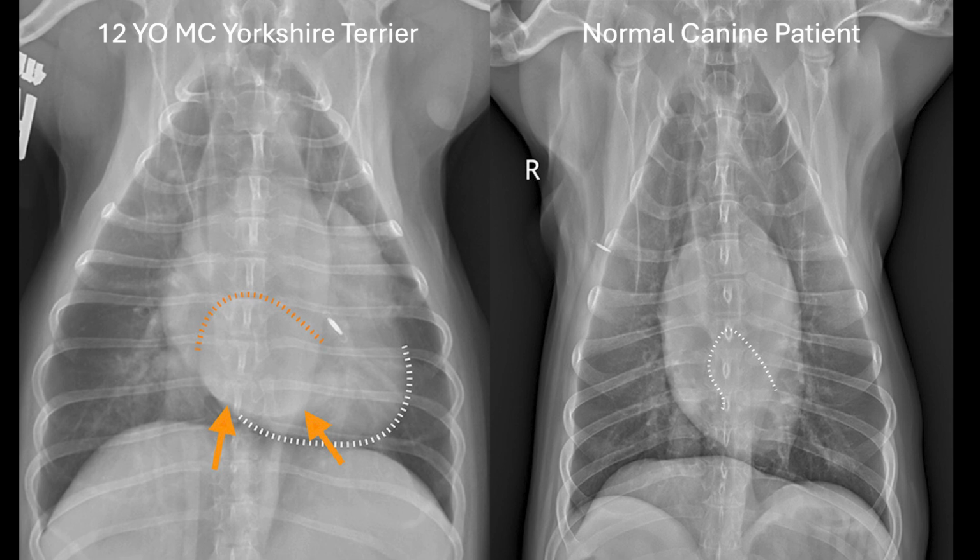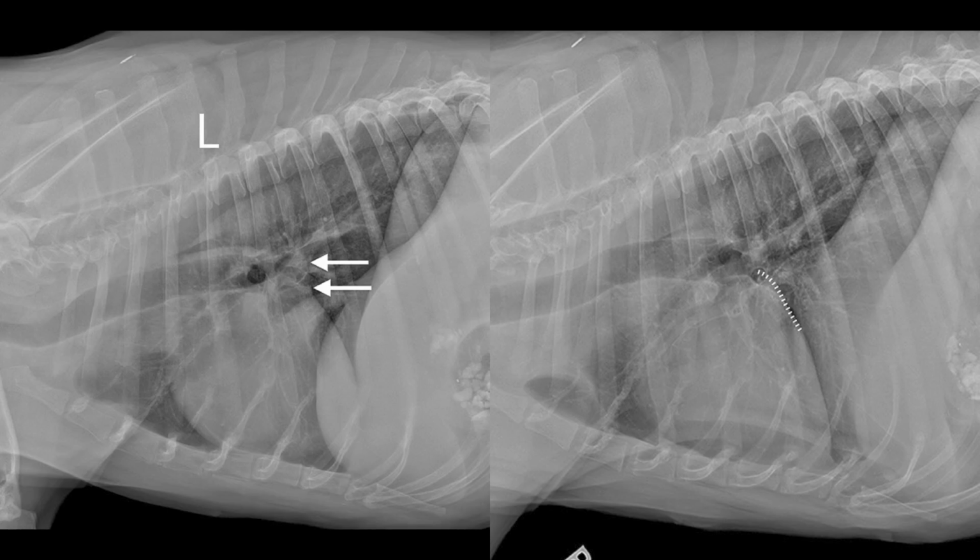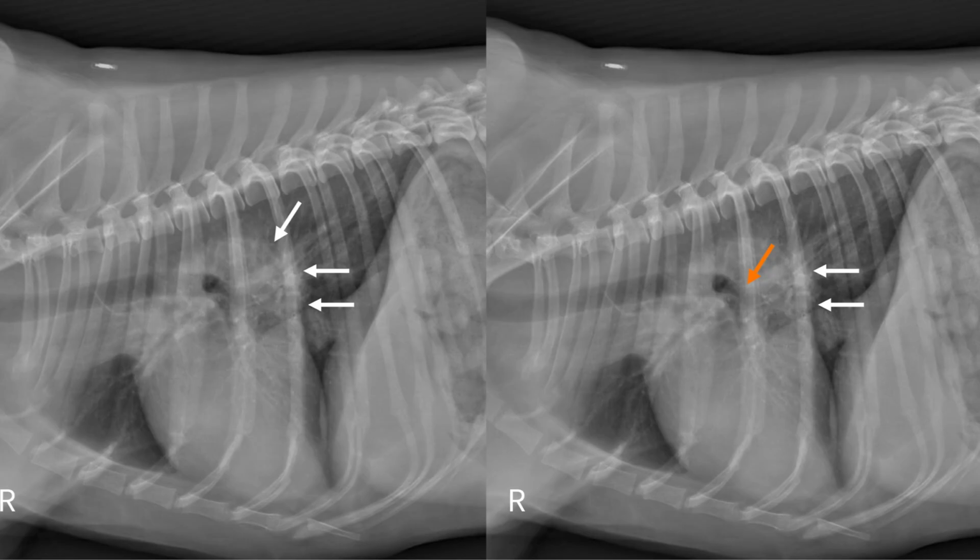Some pitfalls that may lead to false identification of left atrial enlargement include mistaking insertion of the pulmonary vein at the left atrium for pathologic straightening of the caudodorsal margin due to left atrial enlargement, and mistaking tracheobronchial lymphadenopathy for left atrial enlargement.